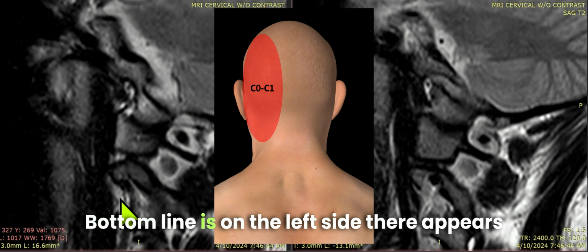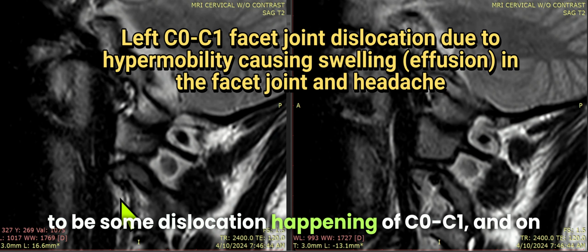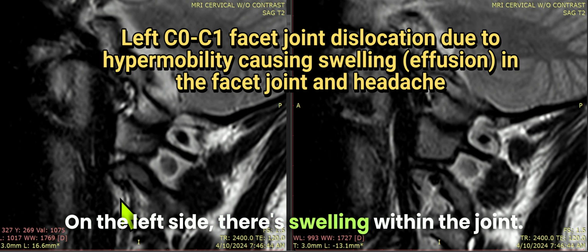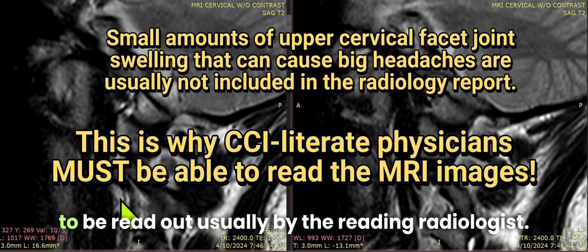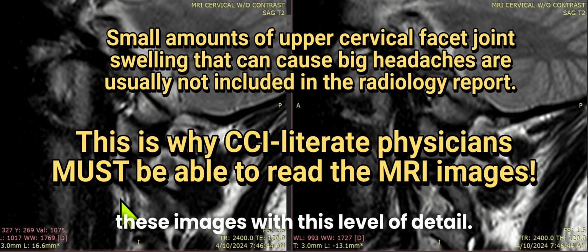Bottom line is, on the left side, there appears to be some dislocation happening of C0-C1. And on the right side, that's not happening nearly as much. On the left side, there's swelling within the joint. On the right side, not as much. So again, realize that this is not something that's going to be read out usually by the reading radiologist. They're usually not going to look at these images with this level of detail.